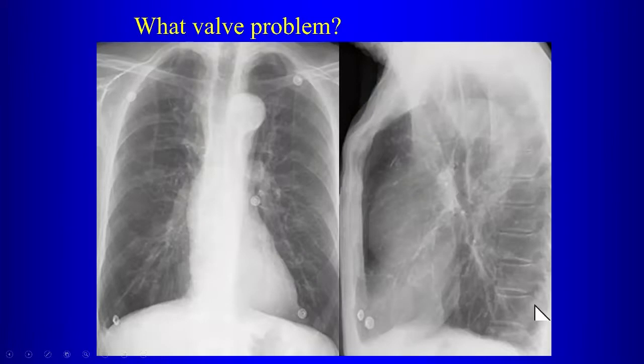Okay. So over at St. Barnabas, if we look at this X-ray, we have a frontal and lateral view. What are the findings? And if there's a valve problem here, what valve problem would that be? Yeah, so the ascending aorta here, you can see is tortuous or dilated, but on the lateral view, it does appear dilated. So is there anything else we see on the lateral view?